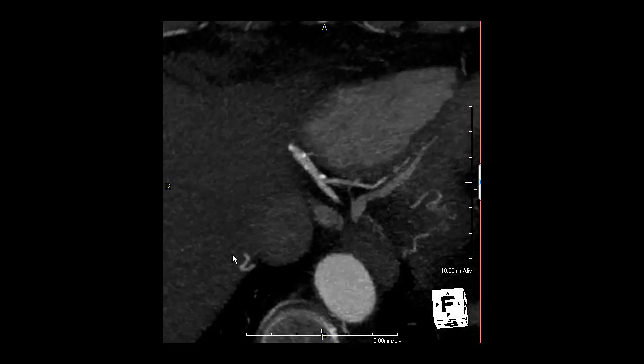In summary, then, we have an 84-year-old patient who's had a stent placed in the right coronary artery 1 year ago. The stent is now widely patent with no evidence of obstructive disease in that segment. However, the patient has had chest pain and shortness of breath, and there is equivocal to obstructive disease at the ostium of the posterior descending from the right coronary artery. There is also equivocal or obstructive disease in the left anterior descending with subtotal or obstructive disease in the proximal portion of a very small second diagonal.